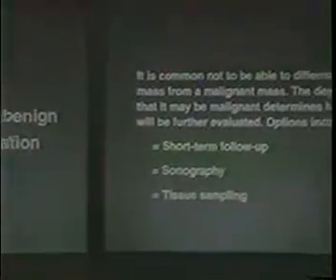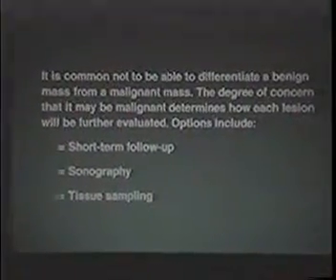When we are assessing a dominant mass on a mammogram, of course, the whole point of it is to decide what to do about it, not so that we can describe something and end the report there. When we do a mammogram on a patient, it makes the patient our patient, and the decision, I believe, is our decision. And it's important to always remember that masses that are definitely benign require no further evaluation. If you know it's not clinically significant, you don't have to do anything more about it.